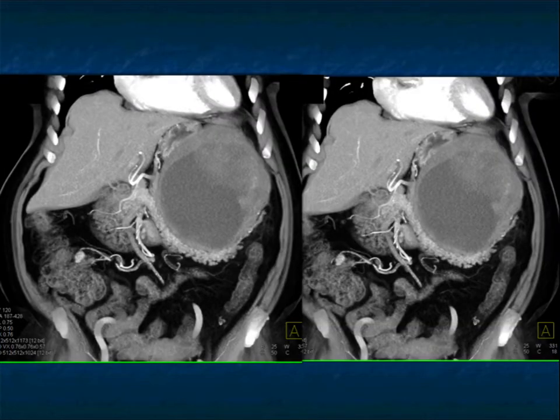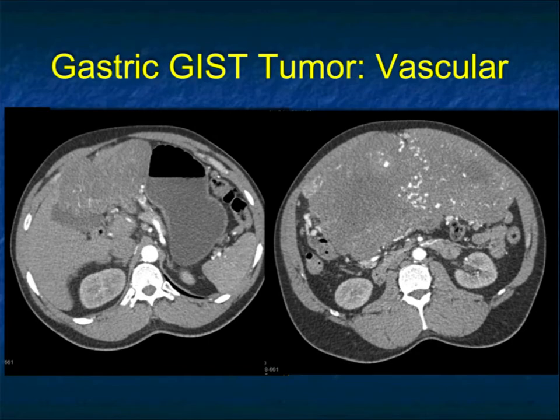There you see the thickened wall. There you see the patient's really aggressive necrosis in the tumor. Sometimes they're vascular, we mentioned. Sometimes they're really hypervascular. When you look at this case, really the epicenter is hard. There's a huge mass. That's not the problem, but where is it beginning?